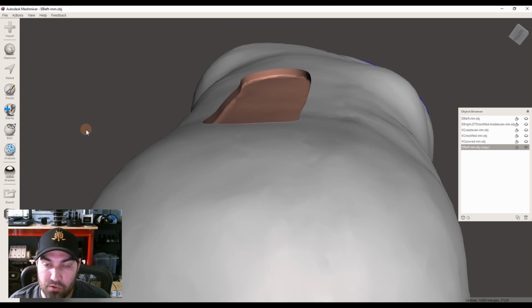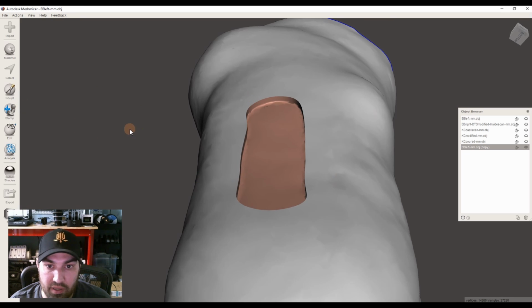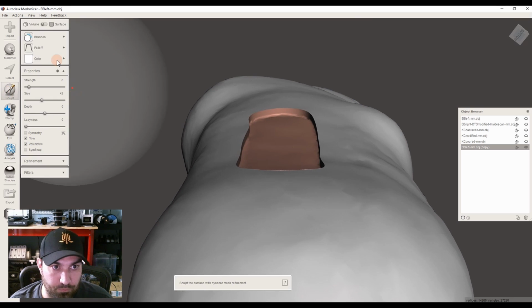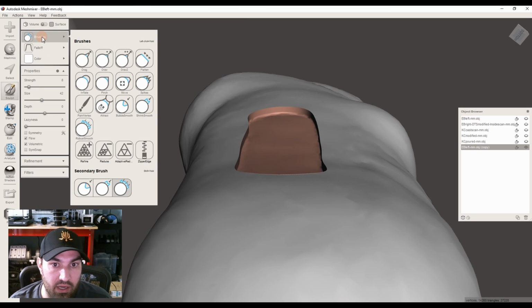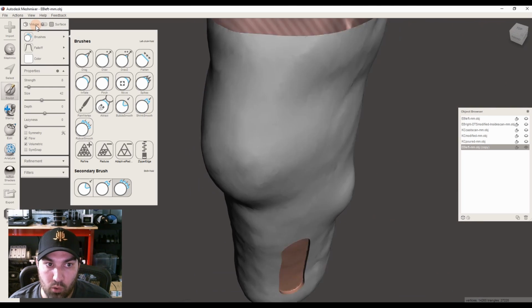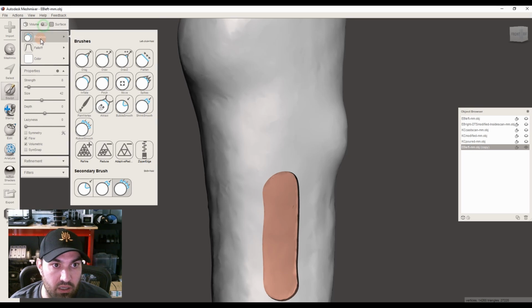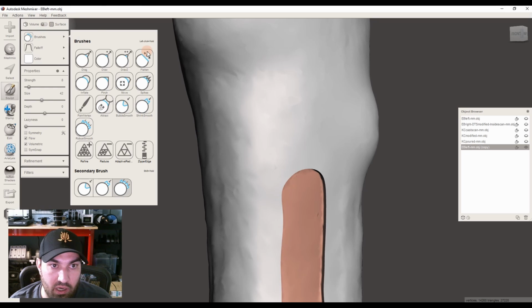The other tools you can use here to start blending and smoothing your edges, rather than selecting and doing the edit to form, you can actually use the sculpt tools. So these are kind of like your plaster tools. So click sculpt, come up here to brush, and in this case we're going to work with volume because we don't have an inner and outer wall. As we get into building products, we might have to flip that over to surface, which actually changes your selection set.